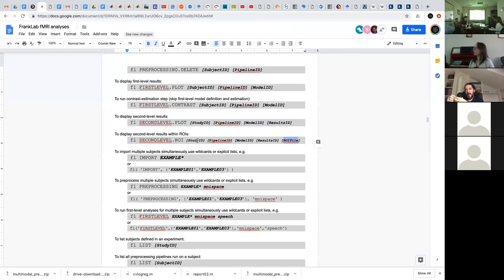And the template is not a T1 file or a template of a structural file, it's a template of the different tissue classes. You have 6 different tissue classes that correspond to gray matter, white matter, CSF, air, bone, and soft tissue. Each of those tissue classes has its own probability distribution map of how it should look in MNI space, and then it tries to take your structural file into that space. That procedure, I think, is fine-tuned to match MNI 152, but to some degree it's not exactly the same as what the MNI 152 used to be, because it no longer uses the template of the structural T1 file in that space to do the normalization.